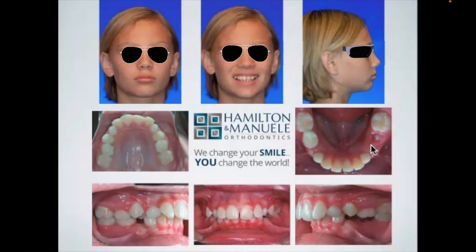All right, so now let's keep going. We have diagnosed this case with probably a good maxilla, a mandible that's retrusive, proclined possibly lower incisors, maybe upper incisors a little bit. We'll see when we get to the ceph. We diagnosed a deep bite, which may or may not have significant wear implications on the lower incisor. We can't really see it 100%, but definitely not severe.